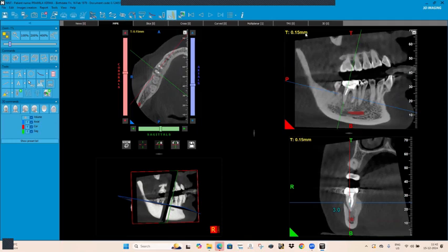Particularly in prosthesis cases where dental crowns or metallic crowns are there, it becomes difficult. But it depends on the clarity of the scan, the contrast and brightness we keep, and of course we have to correlate in all three sections. We have to locate it on the axial, coronal as well as sagittal, and confirm with all three sections.